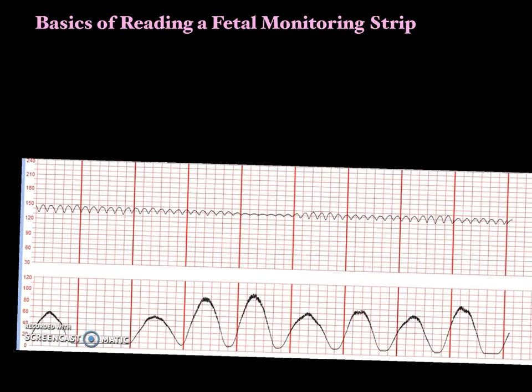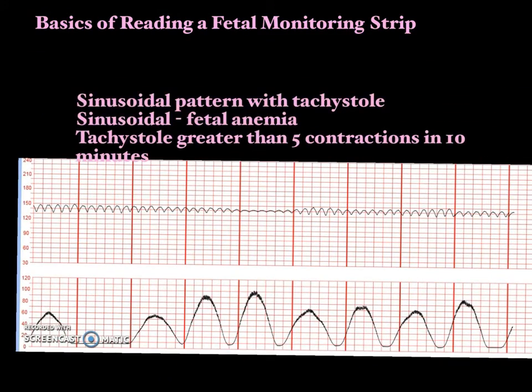Shrink that down. I'm going to put that on here with tachysystole. No, it doesn't want to give me that. Okay.